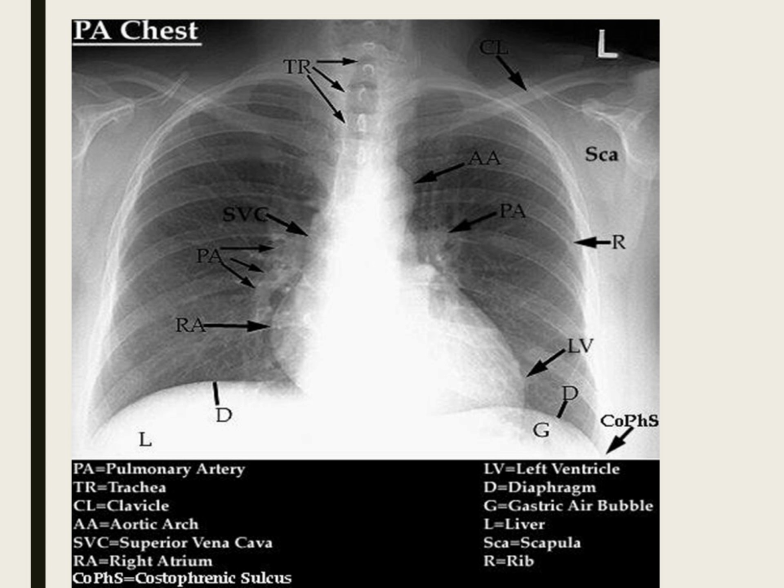Do they have a large pulmonary artery? No, usually not. They usually have hilar adenopathy. So remember, the big lymph nodes are here. People with cancer will have fullness around the pulmonary arteries. Superior vena cava, which is hard to see. I think that's it. Any questions?